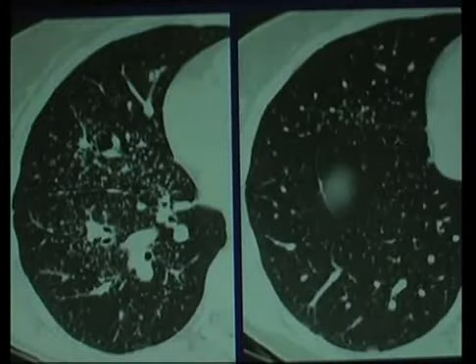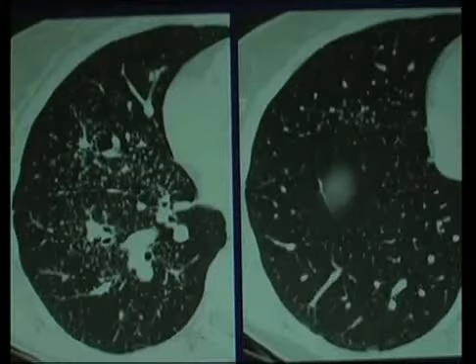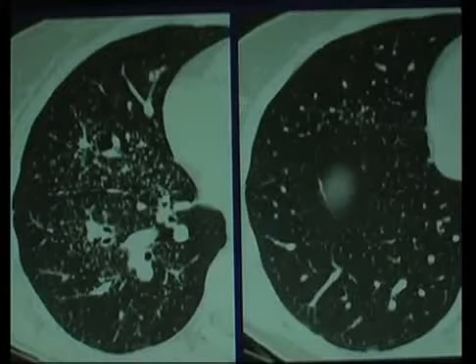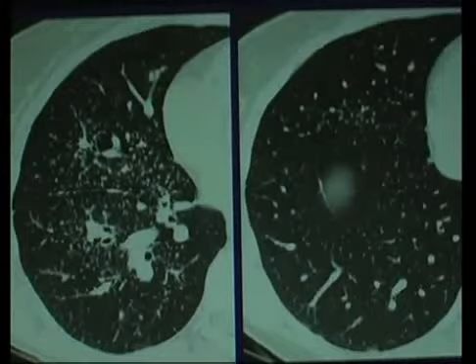Typically, in an early case of sarcoid, you get these potato nodes. If you look at the lungs, they can be perfectly normal. Then you get more and more involvement of the lungs, then the nodes become smaller, and you end up with scarring in the lungs. So what I'm showing you is a characteristic appearance when the predominant abnormality in sarcoid is, in fact, all of these small nodules. But keep in mind, you're dealing with a spectrum of disease always, for all of these.